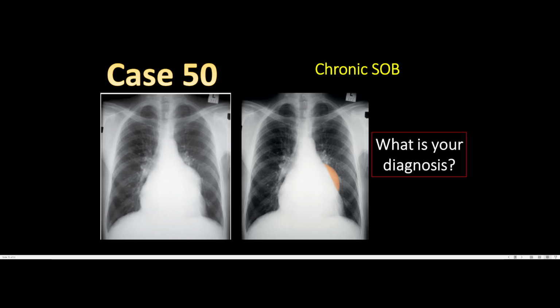So if you have left ventricular enlargement, it will appear on the chest X-ray, but it's not there on this one. If you have left atrial enlargement, then it will appear on X-ray. Please keep this as a principle. With enlargement, there's accumulation of fluid, and it will project towards this side. If you have hypertrophy, nothing will happen. It will appear normal.